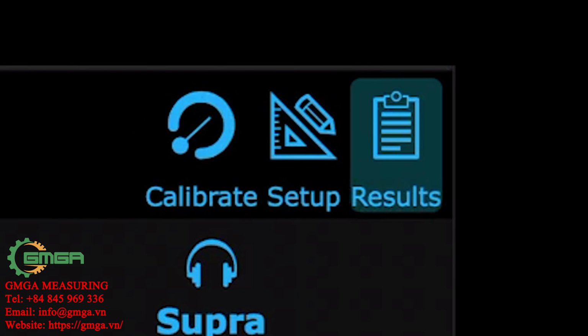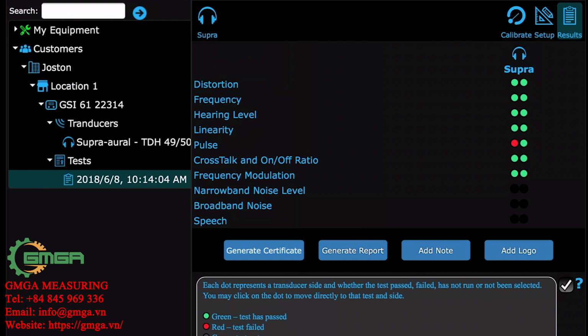After running all the steps, you can go to the results by clicking on the icon in the upper right. The green circles represent passed tests, the reds are failures. The black tests are ones that we're not going to run, and if you didn't run a test that was checked, it would be gray.